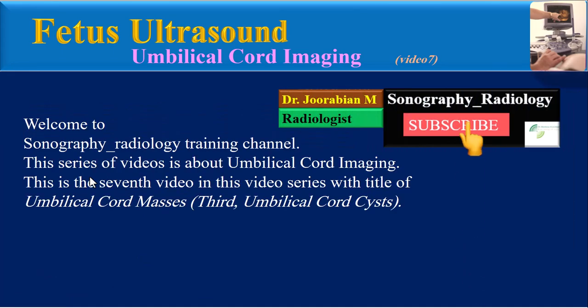This series of videos is about umbilical cord imaging. This is the 7th video in this video series, titled Umbilical Cord Masses. I will try to explain all differential diagnoses of umbilical cord masses in a few consecutive videos. This is the 3rd video in this field, for explanation of umbilical cord cysts.